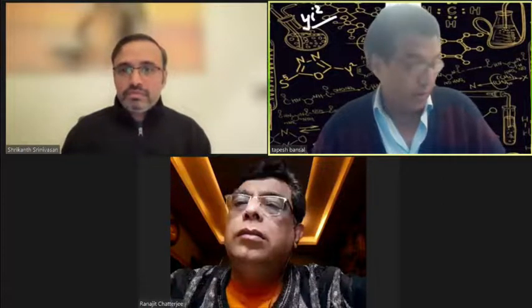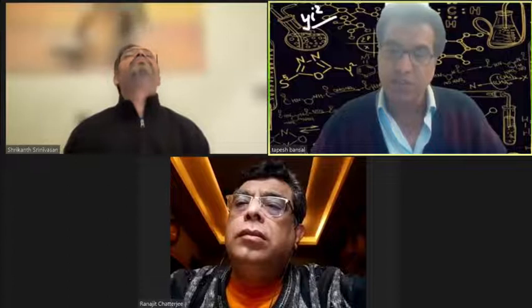Thank you. Okay, I'll share my screen. Just to reiterate a few points from here. First of all, in auto trigger, you will not actually see any triggering going on. Very rarely you may see triggering, but that is point number one. Point number two, what is breath stacking? It includes both double triggering as well as reverse triggering.